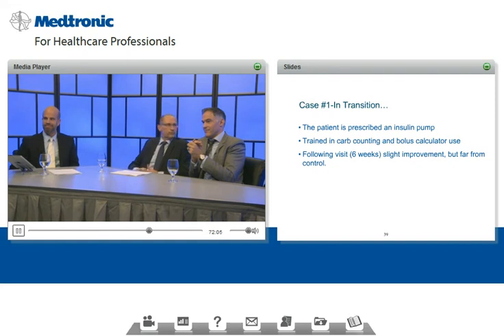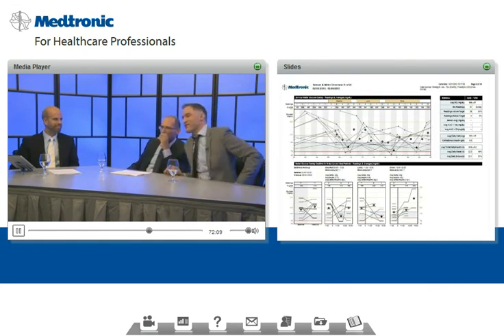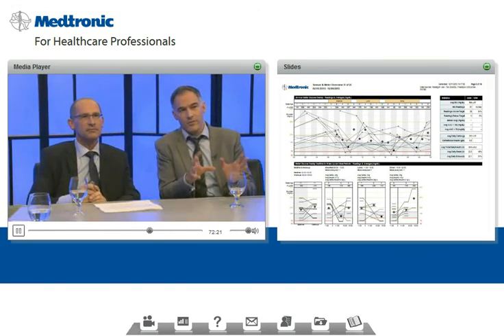You're going to have a much more sophisticated interpretation, but I will tell you what I would do. Here's someone who's engaged. They're measuring blood sugars, 5 a day on average. And prior to dinner, this person has the best, not perfect, but the best blood sugars of the day. Some lows, some highs, but generally their best sugars of the day.